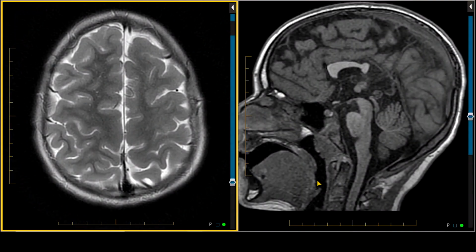This is an MRI of a 6-year-old child with developmental delay. One of the first things we see on this mid-sagittal T1 weighted image is a dysplastic appearance of the corpus callosum. The corpus callosum is foreshortened in the AP dimension. We see the splenium of the corpus callosum, the isthmus, the body, the genu, and the rostrum. We see what looks like all the parts of it, but it's just smaller than we normally expect. The splenium should normally go posteriorly to be posterior and superior to the pineal gland right here. The anterior commissure is also small in caliber.